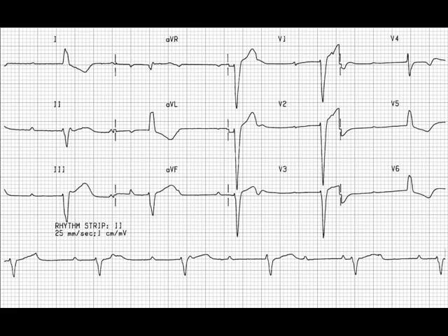The ventricular rate is in fact quite normal at 65. In complete or third-degree heart block, this is often slow, and you do often have a bizarre looking QRS. But the only golden rule is that you will get dissociation between P waves and QRS complexes. So remember again, do mark off your P waves, do print off a long rhythm strip. So we have complete or third-degree heart block. This patient is highly likely to require pacing, perhaps temporary, then moving on to permanent.